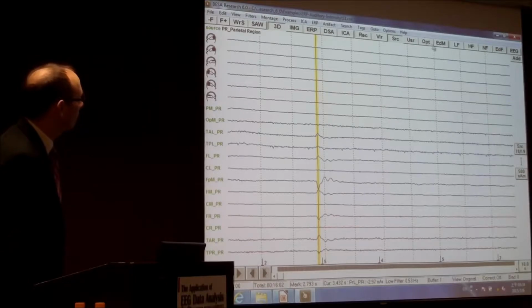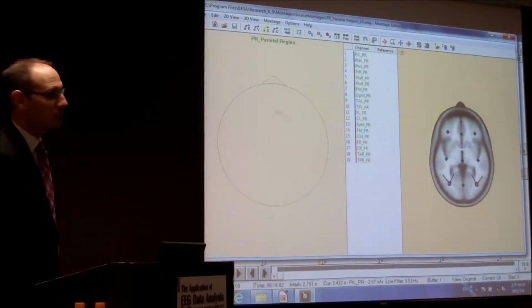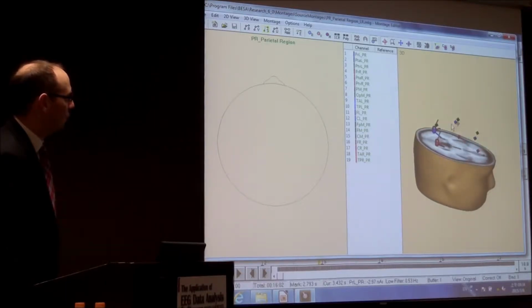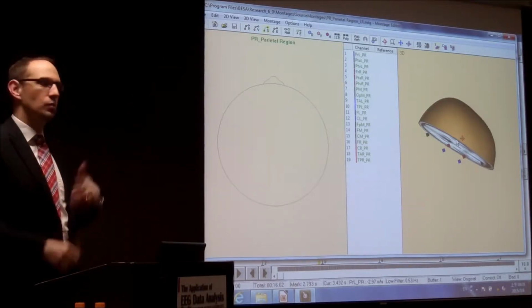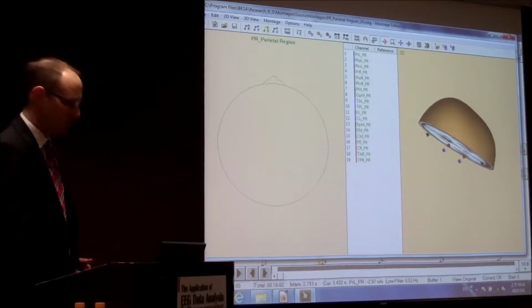So I show you. Source montages like this one look like that. So you see there's nothing on the scalp. But what I have here is I have montages, I have regional sources here, some dipoles here. And that's pretty interesting. And some regional sources here as well. And they pick up all of the signal and we try to explain and transform it back on the scalp. So then you have the signal from the waveforms from these brain regions.